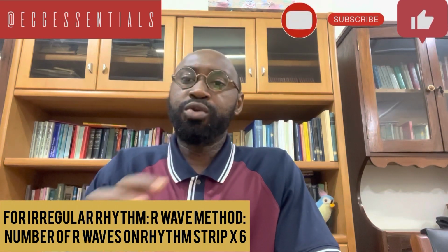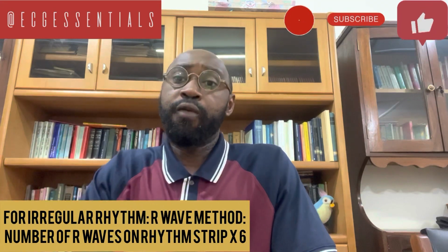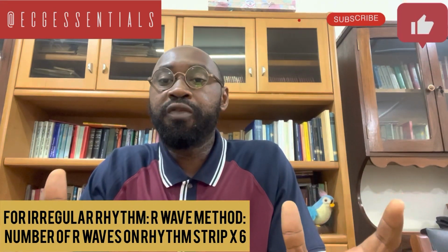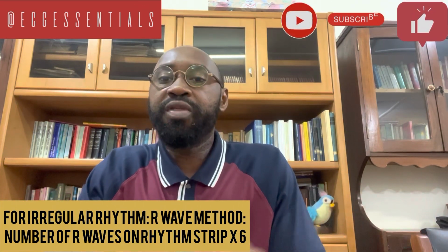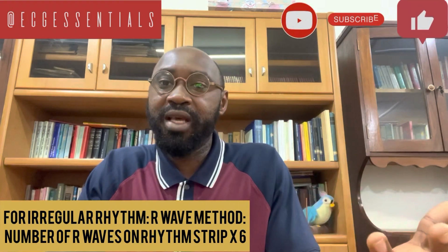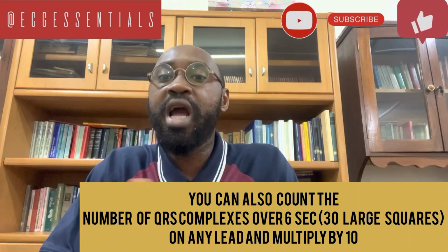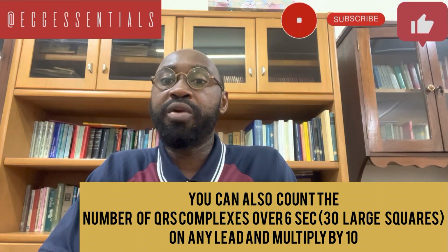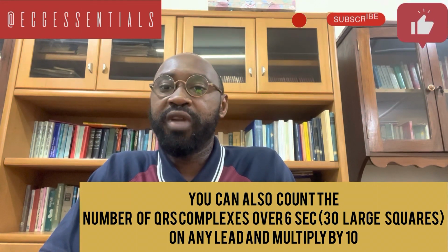Lead 2 will usually record over a period of 10 seconds. So if we count the number of R peaks or QRS complexes on the rhythm strip, that should be the number over 10 seconds. If we multiply this by 6, we arrive at an average rate of the heart.